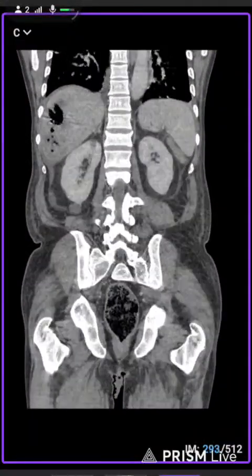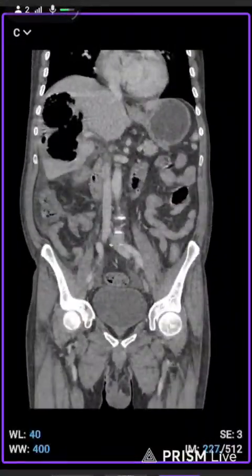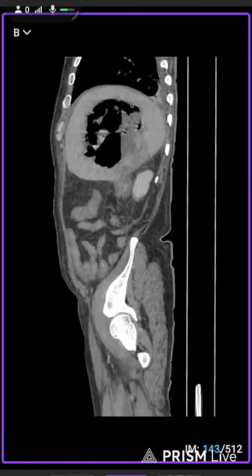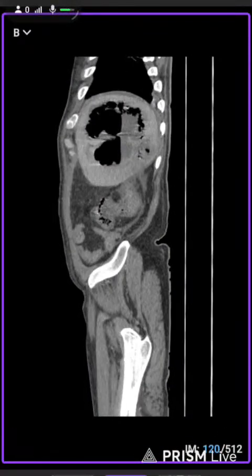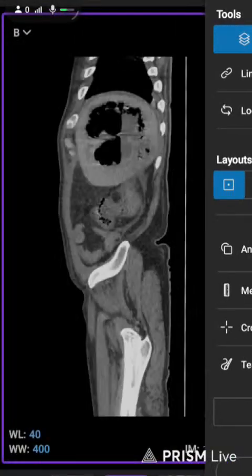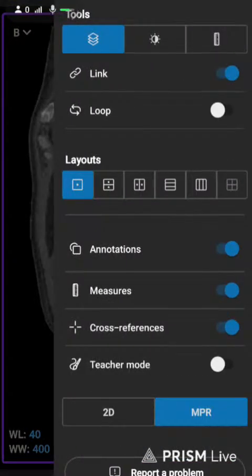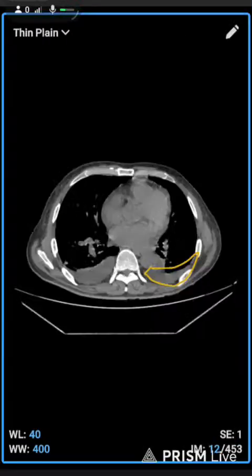And here you can see the liver is totally infected in this patient. We identified whether there was fluid or not in sagittal and axial images. Here is a collection. Is it fluid or is there?